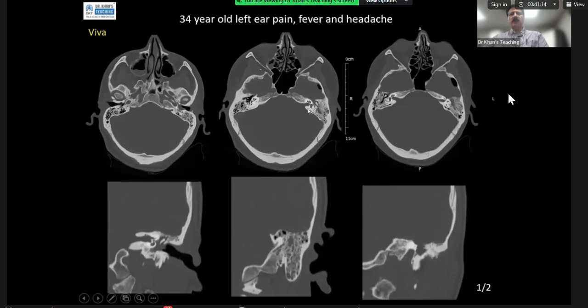The clinical picture is very revealing, but the key finding is that there is acute inflammation happening, and even here there appears to be a bony erosion. And this is coronal, so this is tegmen tympani. This is what we call tegmen mastoideum, which is superior to the level of the mastoid. There is a dehiscence here. This means there is acute bony destruction.